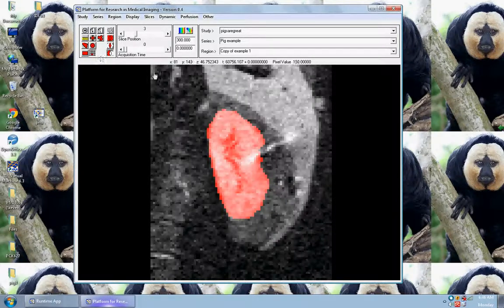And this is also compatible with things like the pixel ones as well, so we can take out little pixels if we like. And then we've got this button here where if we draw another region here, we can see we've just drawn outside and inside the region. The only bit of the region that will be kept is the area that falls within the old region and the new region, like this.